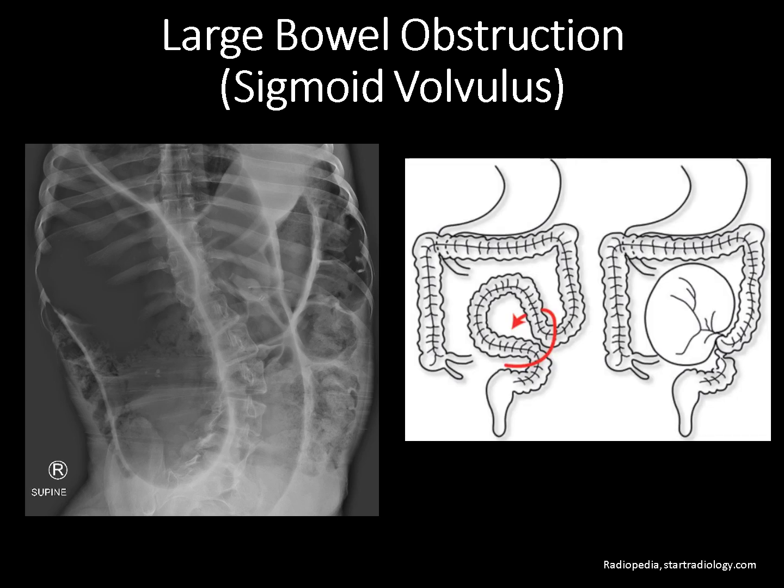This is a cartoon diagram just to help understand the anatomy of what's going on in a volvulus. So this would be your normal orientation. So you have a loop of sigmoid here, and this would twist on itself, causing obstruction at both of these points. You can imagine if you twisted this loop, it would constrict on both of these points of the large bowel. So you get this, in effect, closed loop obstruction where this is twisted, and you have two adjacent transition points with no way for the pressure building up within this loop to be relieved, and this now becomes massively dilated, giving us your coffee bean sign.